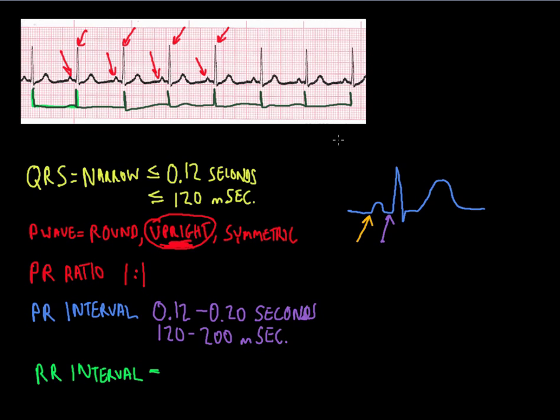So for example, if I had a rhythm and I went, that's a nice regular rhythm. It's consistent. Kind of fast for a heartbeat, but you get the idea. If it was, you can tell that would be an irregular rhythm. There are irregular pauses. The distance between each beat is not going to be the same. So for the R to R rhythm here, one would pretty logically guess this should be regular.